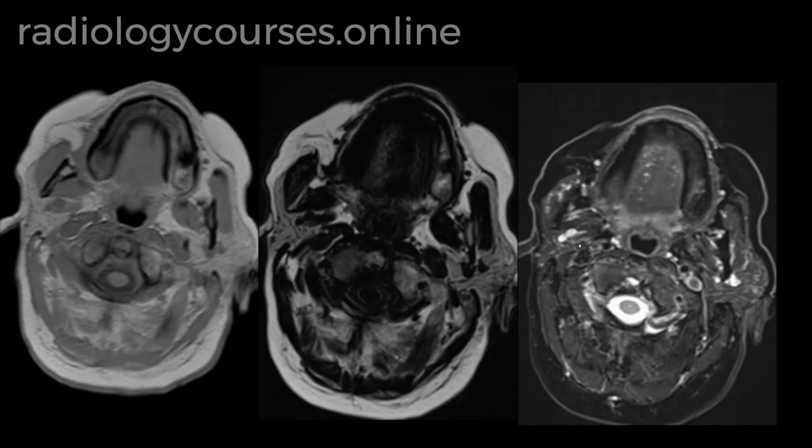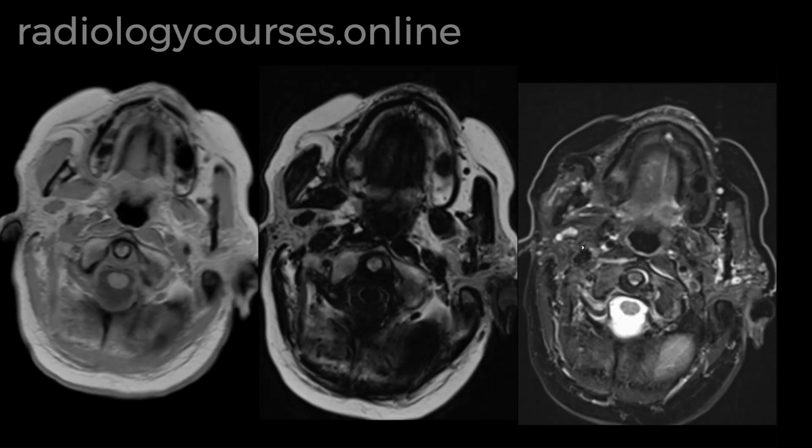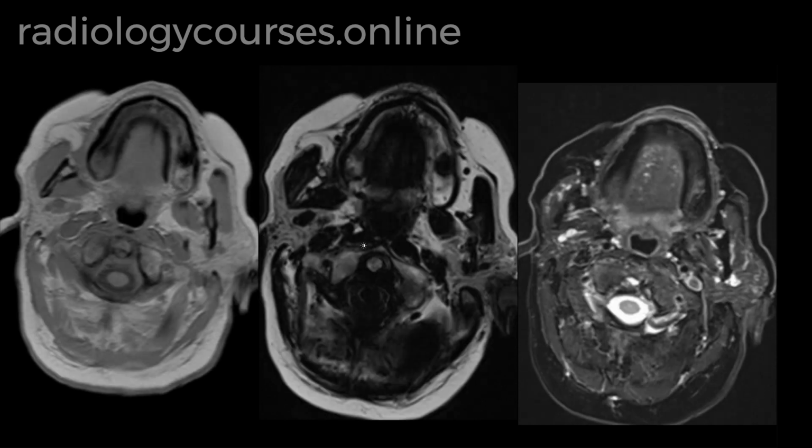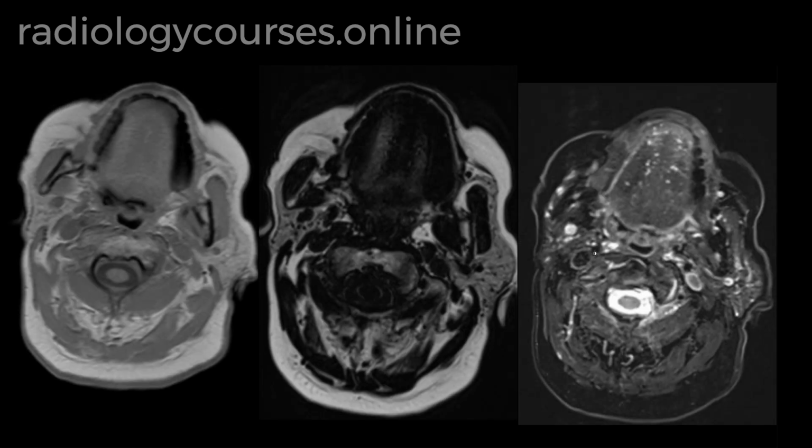superficial and deep lobes. It shows homogeneous increased signal intensity on Dixon water sequence, and when we suppress the water, it shows homogeneous low signal intensity on Dixon, and on T1 sequence, it shows low signal compared to the parotid gland and is iso-intense signal compared to the muscle. The margins are thin and smooth, and there is no evidence of extension beyond the parotid gland.